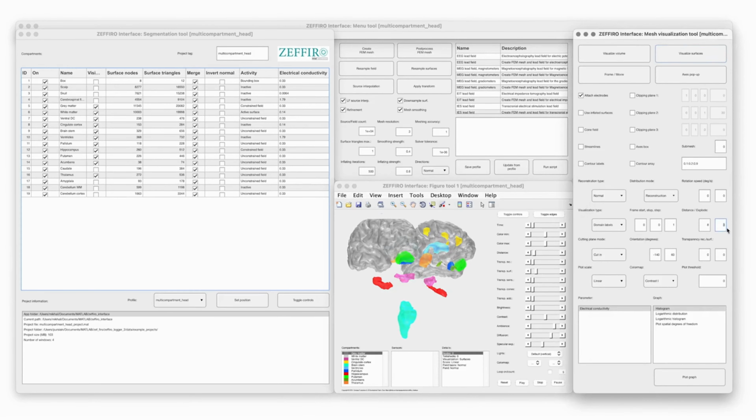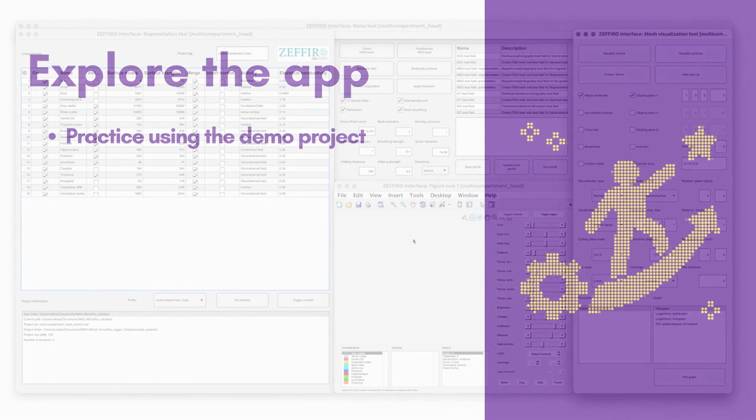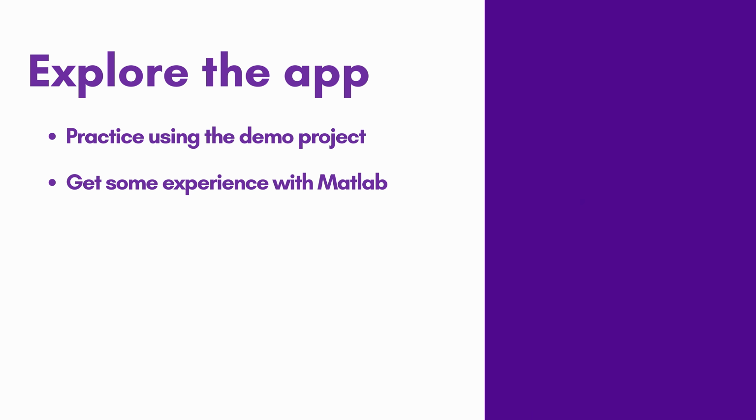Now that you have a foundational understanding of the Zeffiro Interface, we encourage you to explore the software further and practice using the demo project. Since the app is built upon the MATLAB platform, having prior experience with MATLAB can help understand the underlying processes and troubleshoot potential issues.